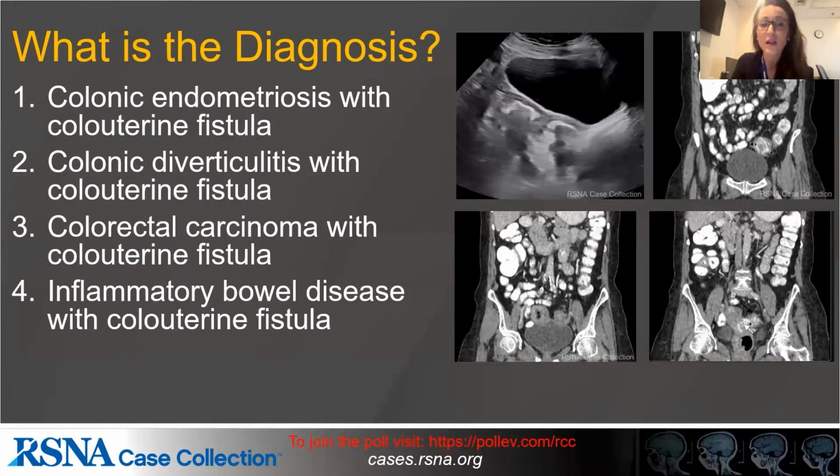Is this colonic endometriosis with a colouterine fistula? Is it colonic diverticulitis with a colouterine fistula? Is it colorectal carcinoma with a fistula, or inflammatory bowel disease resulting in that colouterine fistula?